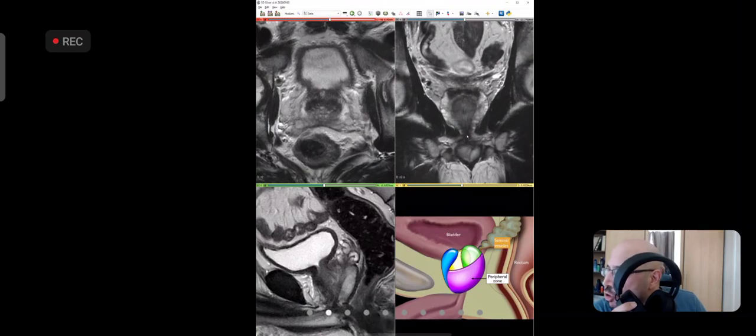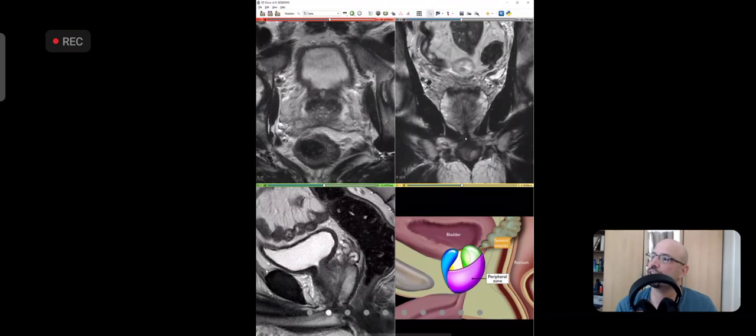So this section of the urethra, you have to measure it. Okay, when you find a cancer, you measure the proximity of cancer with it, and the length of the membranous urethra. So again, involvement of neurovascular bundles and length of the membranous urethra have a role with continence following surgery. So surgeons are sometimes interested in knowing these two things.